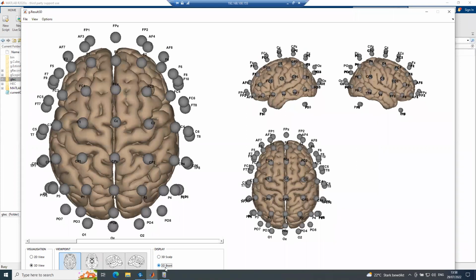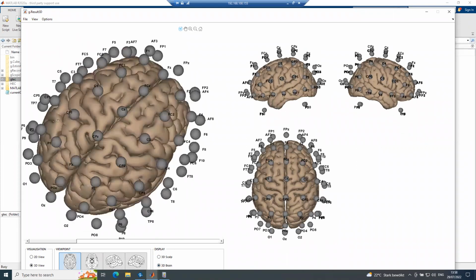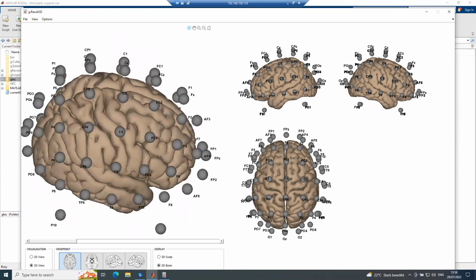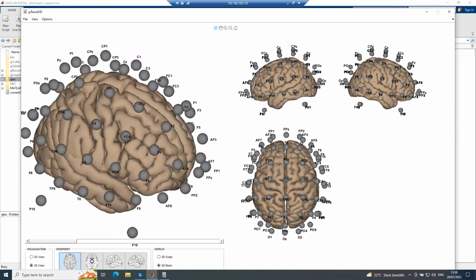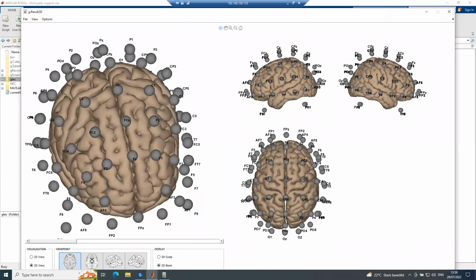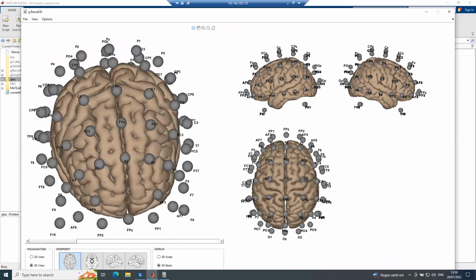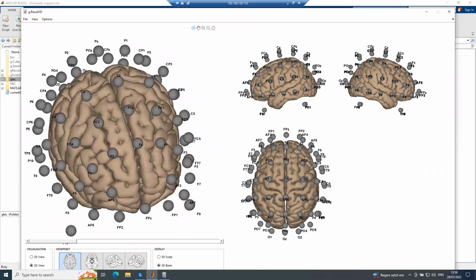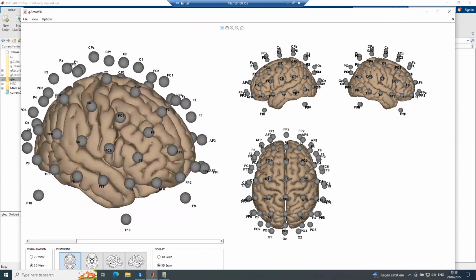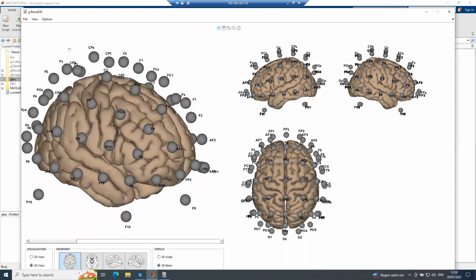And then it will show the cortex visualization. For those EEG montages, we currently use the general brain model, the MNI brain model, but it's also possible to load the brain model. I will show it afterwards with the Cortiq importer. I just want to show you the options.